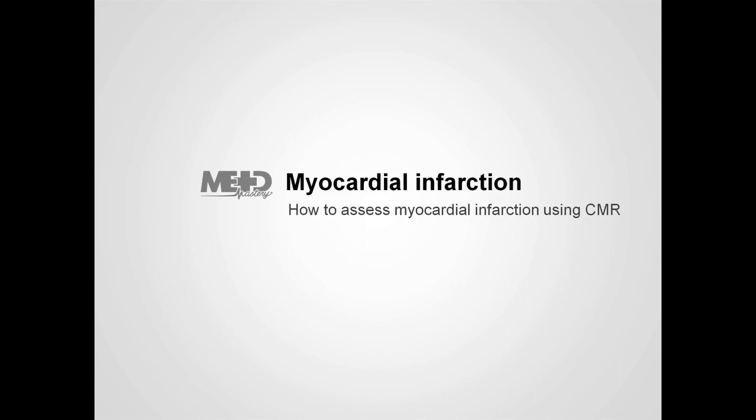The key to imaging areas of myocardial infarction is the use of late gadolinium enhancement, and that's what we're going to learn about now. In this lesson, we're going to look at the assessment of myocardial infarction using CMR.